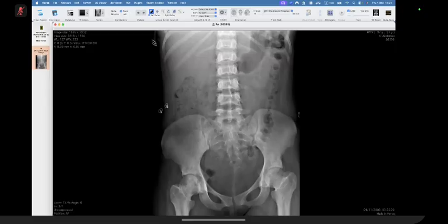Now, you got this case, it's sickle cell disease. You got it. I think sometimes we are too obsessed with giving a management plan. We are too obsessed with feeling we have to say something. No, you don't have to, right? You can just say the overall imaging appearances are consistent with sickle cell disease. I would let the clinical team know that at this point in time, I can't see any sort of collapse of the femoral head, right?